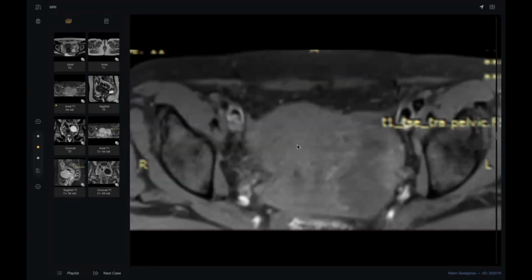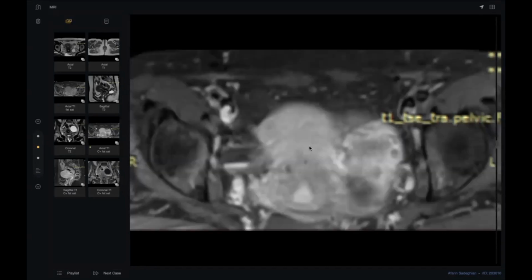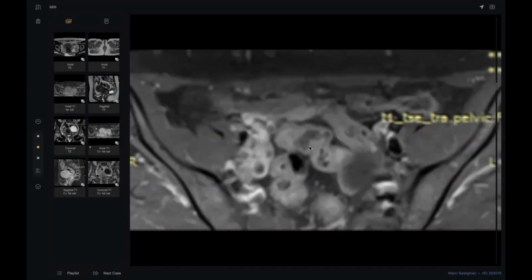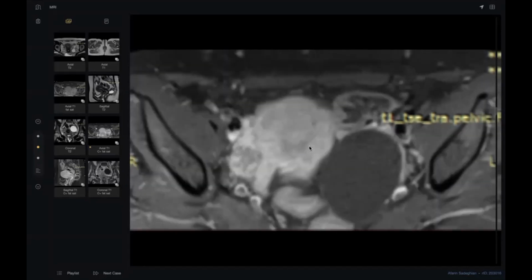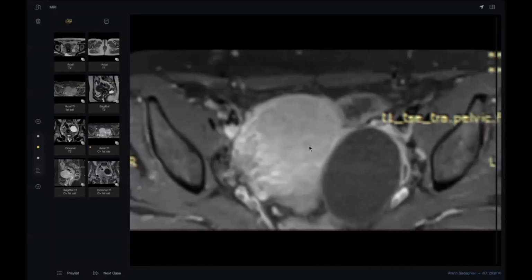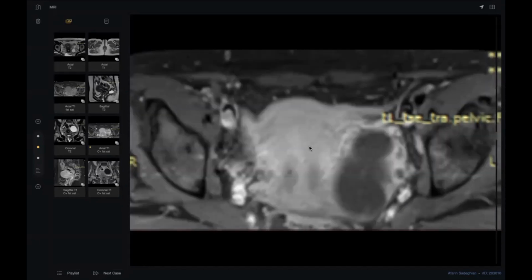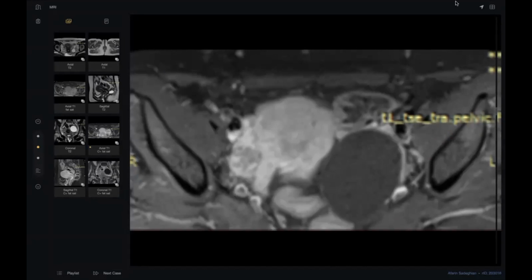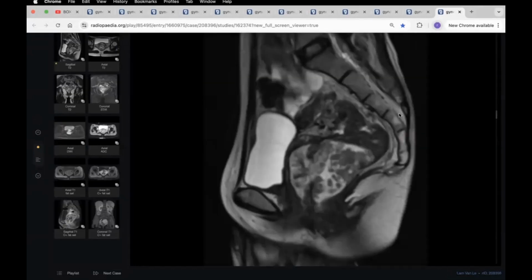No clue for hemorrhage or fat. No enhancing mass here at all. So at least for the exam, this is a non-aggressive cystic lesion with no mass, with a very smooth thin wall. So this is a benign cystadenoma. Very tricky case. Thank you, doctor, so much. You did very well. At least a tricky case, you corrected yourself, but very nice. Next candidate.